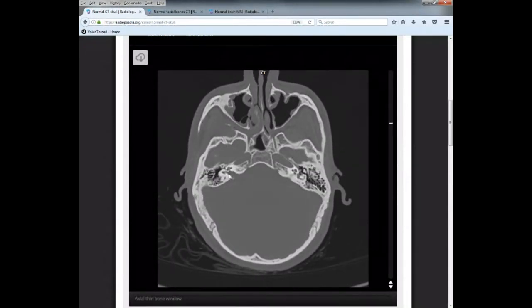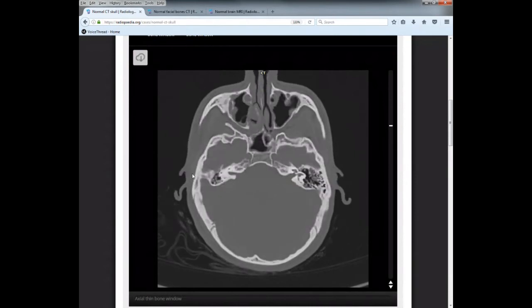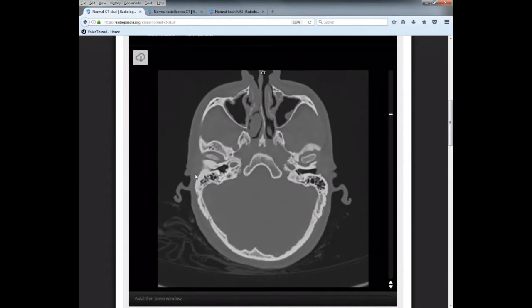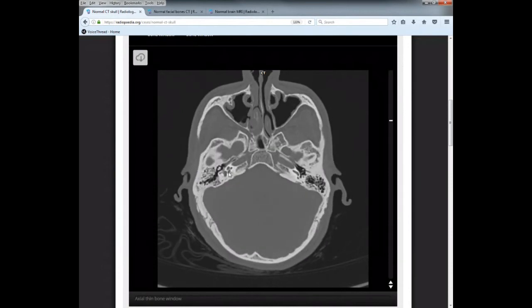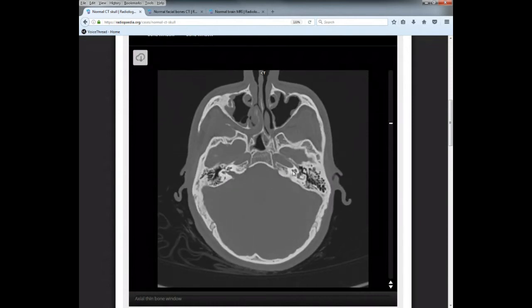Okay, and you can see in here, I'll show you, if you follow the EAM, come into the EAM, you're going to see these little dots just medial to the EAM. All right, EAM dots. Okay, that's your inner ear. Those are like your ear bones. Is it the malleus, the conchae, or I'm sorry, cochlea is in there.